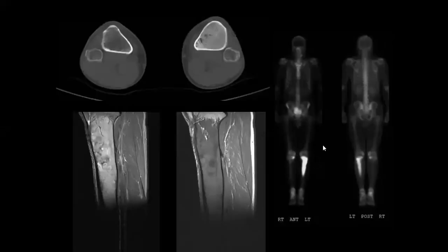Yeah. So this is the CT appearance, and this is the MRI appearance, and this is the bone scan appearance. So what is going on here? Can you describe here? I think after all these modalities, it's now easy to recognize it. But in X-ray, you should put other differential diagnosis involving infection and other types of tumors. But fibrous dysplasia will be one of the commonest, and you should put it in your consideration.